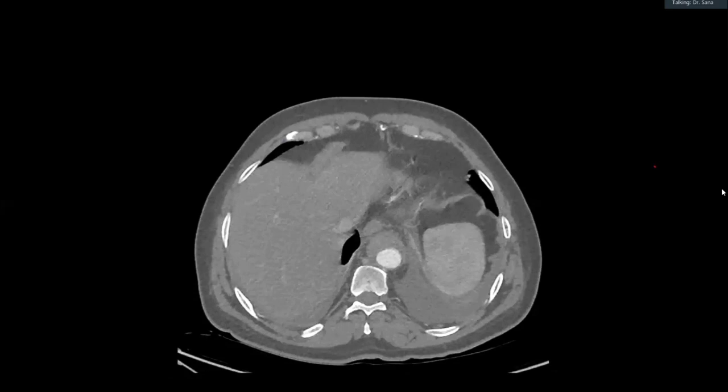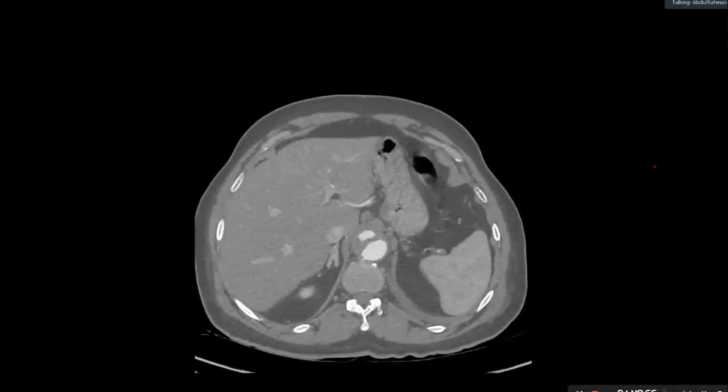Is there any intervention done or any trauma history? All right. So there's no history of intervention, and there's no history of trauma. So this is a hematoma of the aorta. And this patient came with chest pain. Do you know the name of this condition? And while you're here, tell me what these are. You didn't tell me about these.